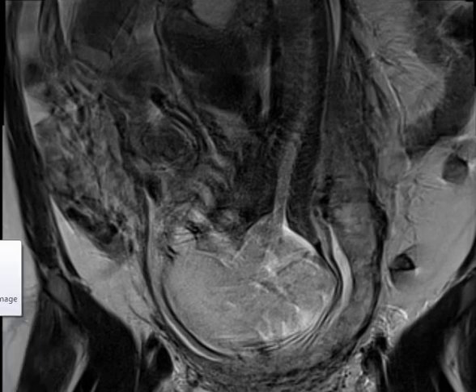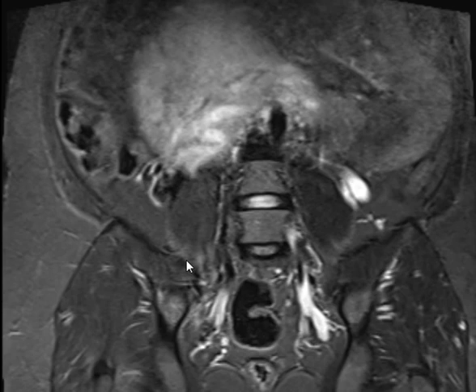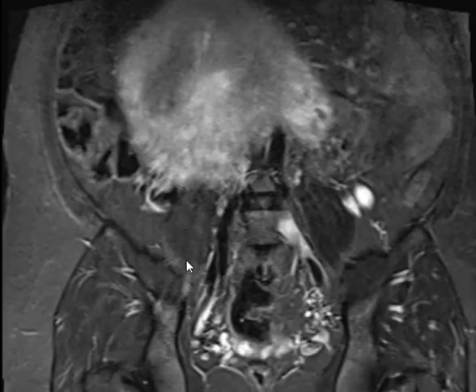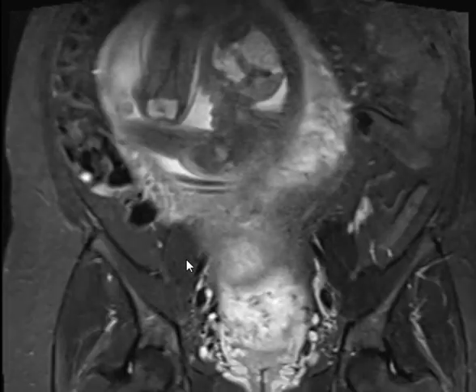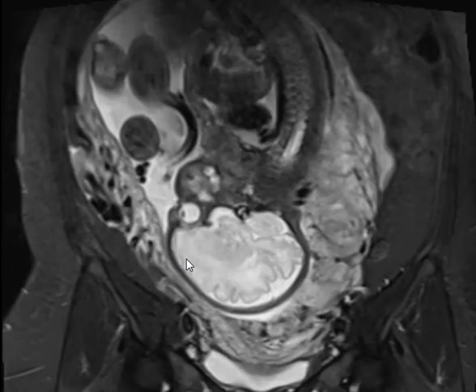So anyway, we need to do fast imaging sequences because of the fetal movement. We have special sequences that are very fast, like 10 or 15 seconds for a sequence. And whenever we see placenta previa, like in this case, we should suspect what? Accreta. So let's see. This is coronal MRI.